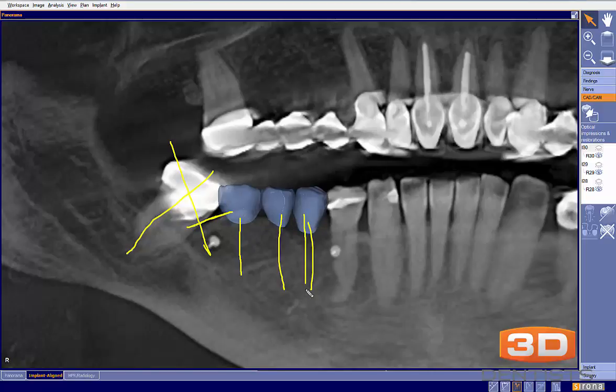Maybe get an implant more like right here, a little bit there, so we can have a bigger tooth, and then a bigger tooth here that just gets us contact to right there, allowing us to place this implant right here and graft this area and get rid of this potentially failing issue and this mesially inclined tooth that will have a food trap for us.